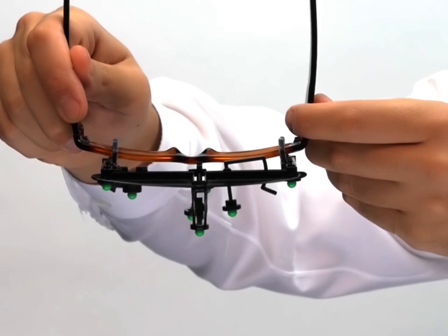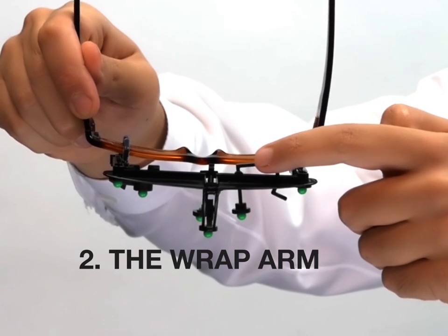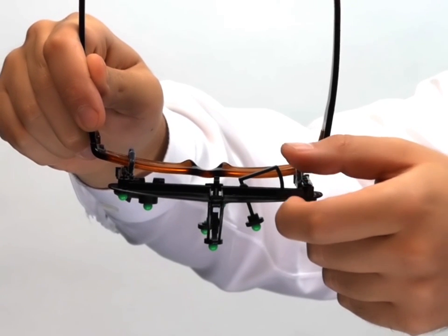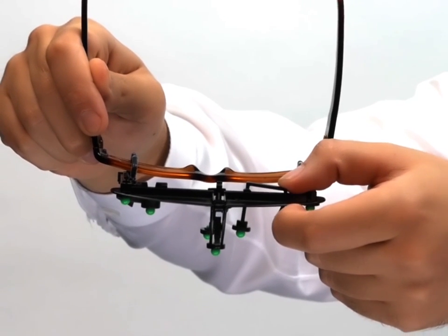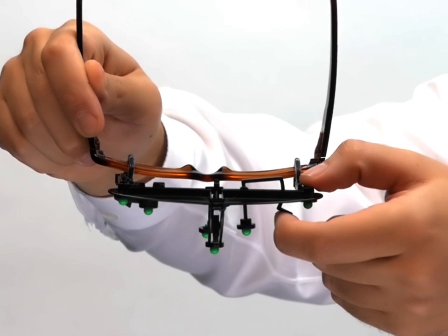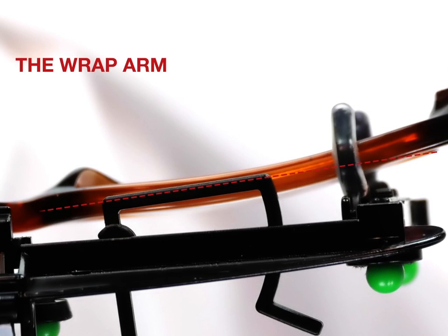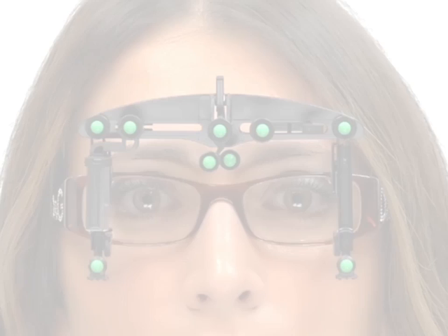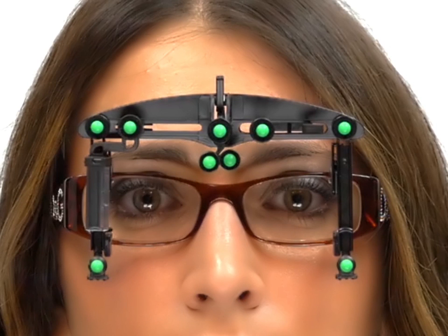The wrap arm consists of a pivoting ledge located at the back of the EY stick. Looking from above, rotate the ledge back and forth until the ledge is parallel with the curvature of the eyewear. This will measure the frame wrap angle. Once the EY stick is secured and the wrap arm is set, ask the patient to wear the eyewear in the way they normally would.